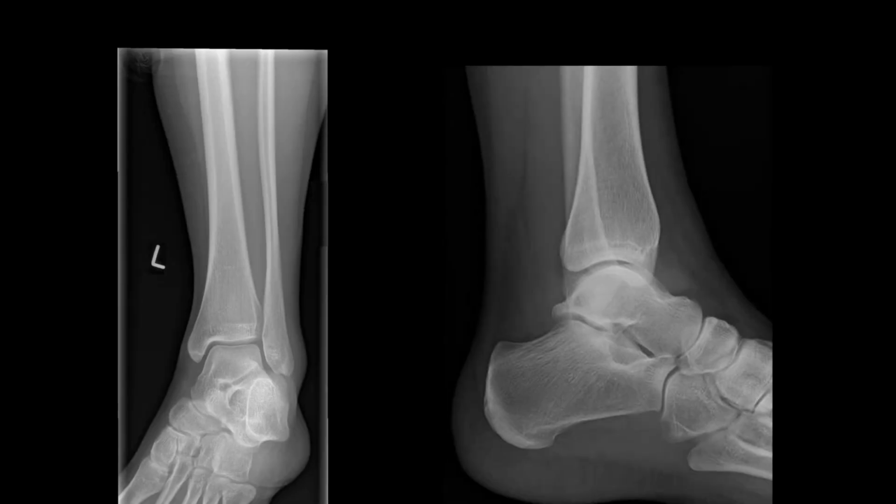Moving on to ankle x-rays. Over here we have two different views: the mortise view and the lateral view. Starting with the mortise view, we're going to look at A again. If we look at the images, we should see our tibia and our fibula. We should see a small area of overlap distally there. Any spacing between here would suggest a rupture of the syndesmosis, which joins the two via the interosseous membrane.